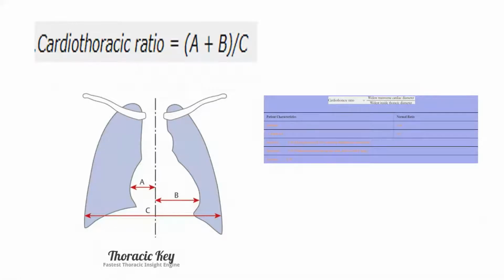Is it the myocardium? No, not necessarily. Because the outer border of the heart, as seen in X-ray, is the very outermost. So I'm going to take you to echo, and imagine with me the parasternal long axis. What do you see there?